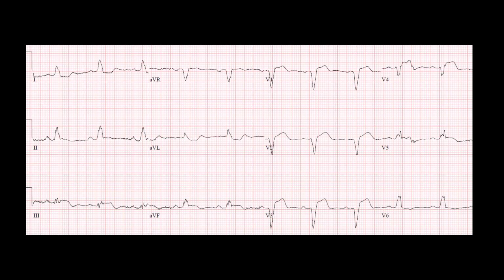This is another positive finding. So if I look at this left bundle, I see some ST elevation in V1, V2, and that's normal. QRS is down, T wave's up, ST segment's going with the T wave. That's what I expect because it's appropriately discordant. I measure that ST elevation. It's not greater than 25% depth of the QRS, no big deal.